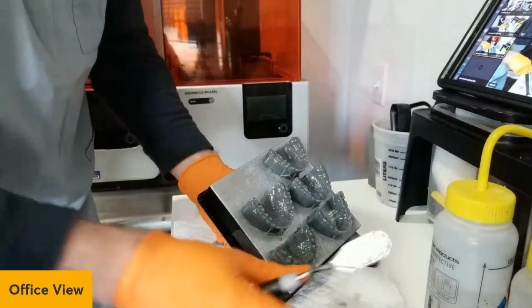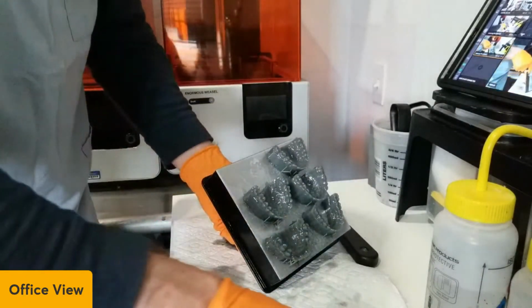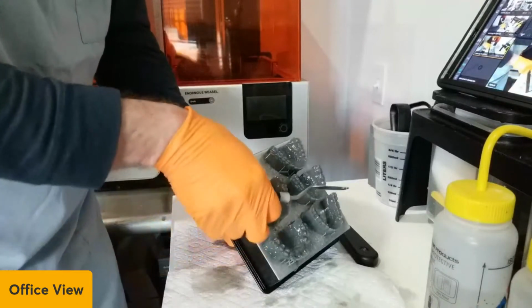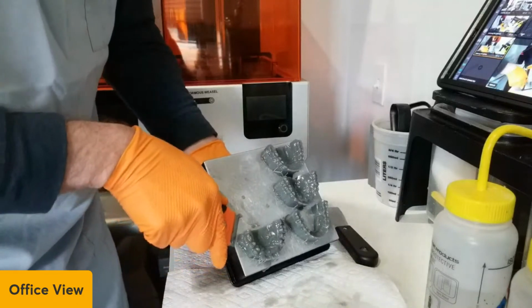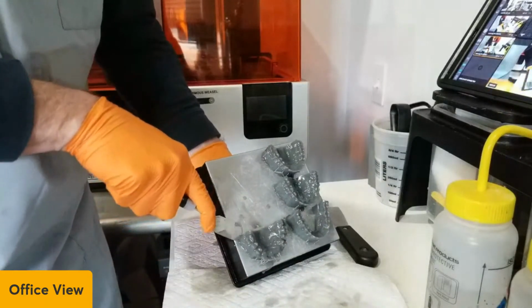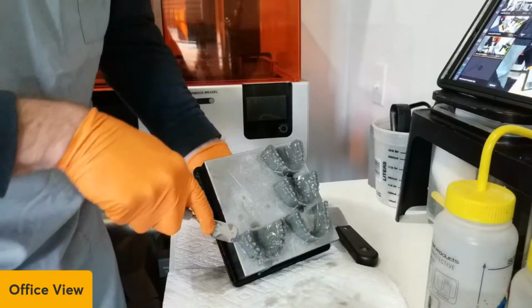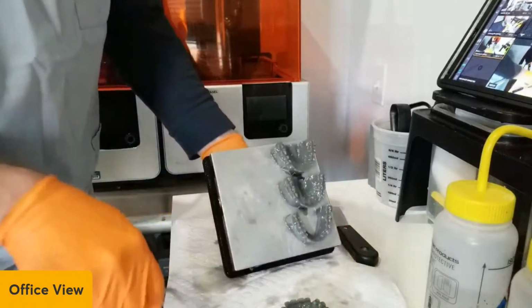So you do have, the only bad thing about this is I can't start it. I have to start it with the razor blade. So you got to go through a couple tools here. So slide that. Okay. And then let that drain right there. I'll just work my way around. Just take your time. You just spend a few hours printing this. You don't want to break these, because then you just got to turn around and print them again. Oh, I didn't clear that out good enough. There we go. So, well, there we go. So I like this tool.